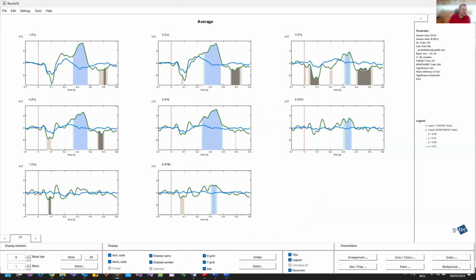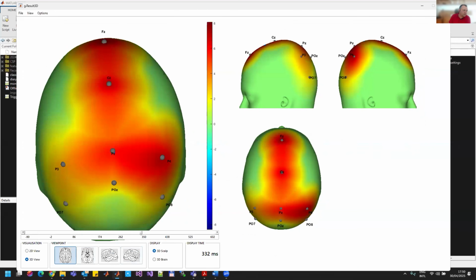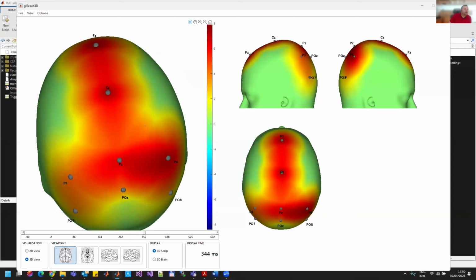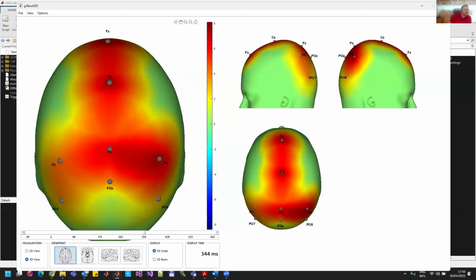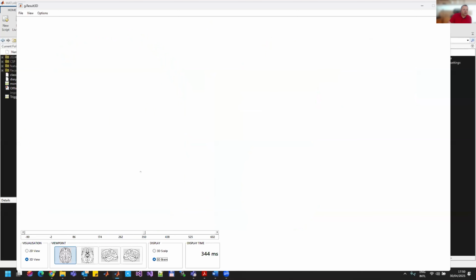to the right at about 340 milliseconds. Where's the peak? Here, and about in here. Yeah, in here it's better. So here we have the regions where the P3 had the highest activation, the activation areas, let's say so, the P3. Okay, in the same way, we can see it also directly on the brain.